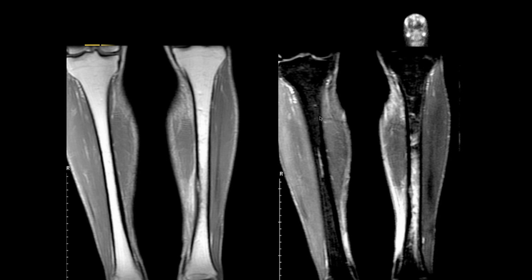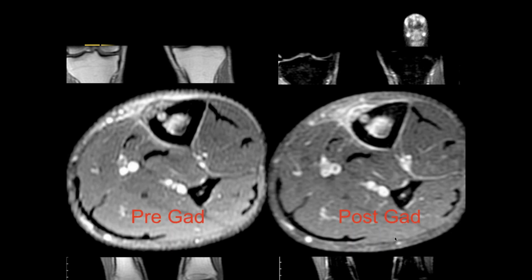So you see a lot of edema of the diaphysis of the left tibia, and there might be even some significant soft tissue edema along the medial aspect. It looks like there is, within the cortical margin, is that a fluid? Is that enhancing? I think it's not enhancing much. There's a lot of soft tissue enhancement. So okay, syphilis.